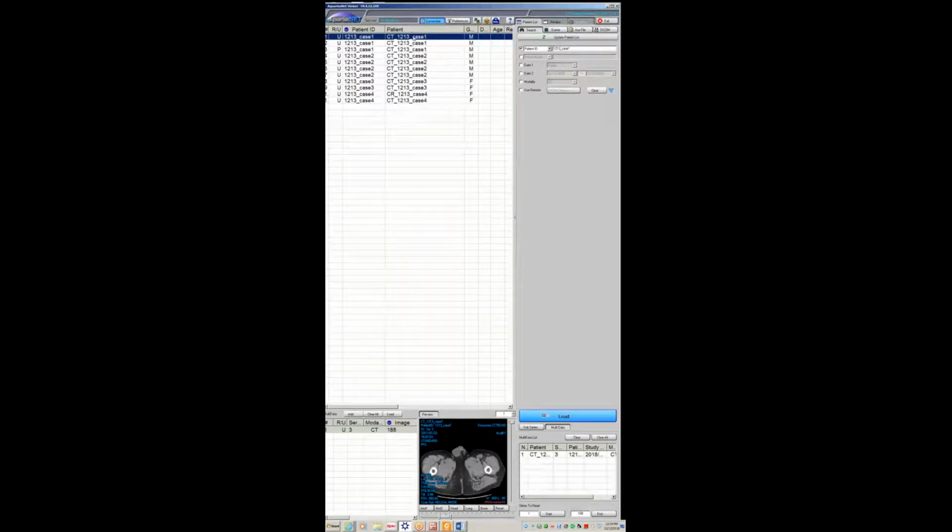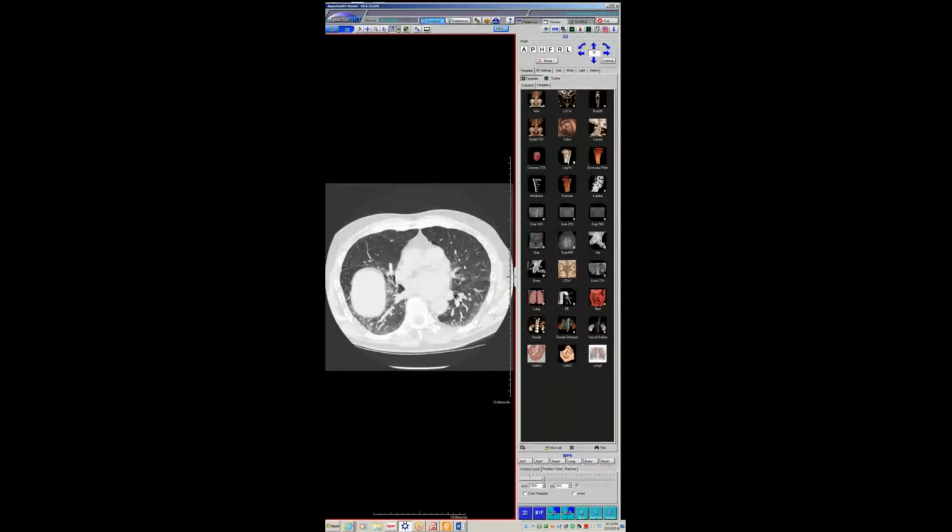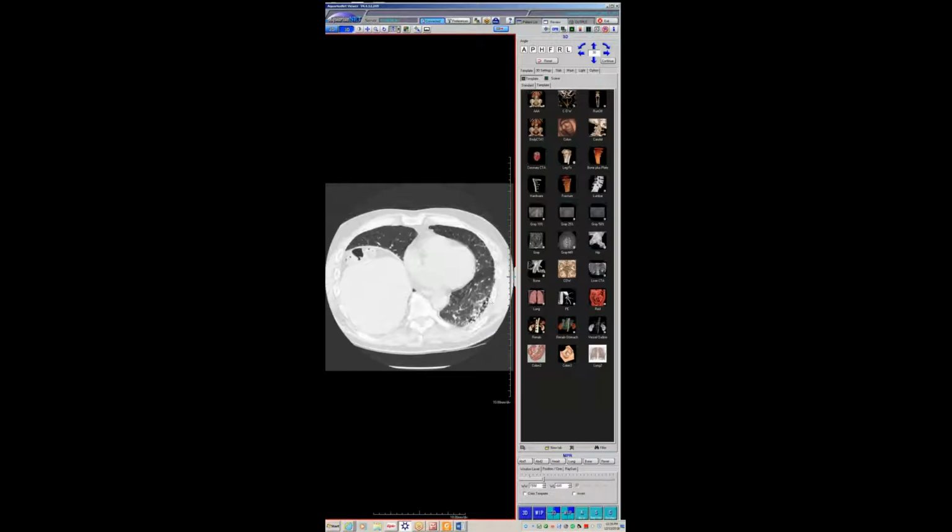But what was interesting is that, first of all, it's been increasing in size, which is not that unusual, these do change, but this is many, many years ago. This is about 8 or 9 years before that. We can see it's increased in size. But what's fascinating to me was that we happened to get expiration imaging on this, and that thing completely collapsed down. Wow.